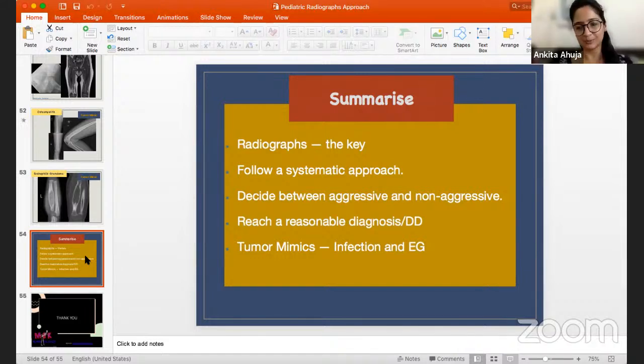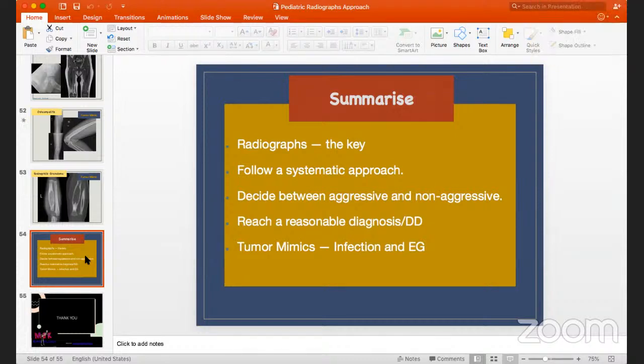So, what you had shown was a clear-cut chronic osteomyelitis on the radiographs. So that is easily identifiable. But sometimes it's really difficult, and we do face that in our practice also. And sometimes in such cases, history and any prior radiographs which have been done are also very important. With radiographs, I feel as radiologists we really don't get hands-on, but I think you would be better placed. If you have a prior and you can see how the changes have happened.